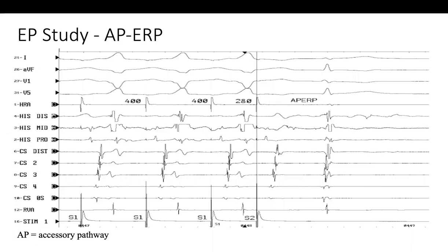Right-sided. Left anterior septal? Why? No, wait. Left anterior. Inferior septal. Left inferior septal? Okay, let us take one, since we have with us Dr. Samir from KFMC. Welcome. If we take V1 negative, the delta wave is negative. So where is our next stop?